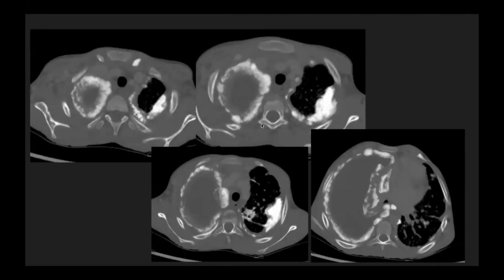Okay, CT was done. In the CT, we see that these lesions encircling the entire hemithorax were actually not in the pulmonary space. They were in the pleural space. See how beautifully the pleura has been delineated by a dense, thick, ossified lesion. It is almost like encircling the visceral as well as parietal pleura with soft tissue within.